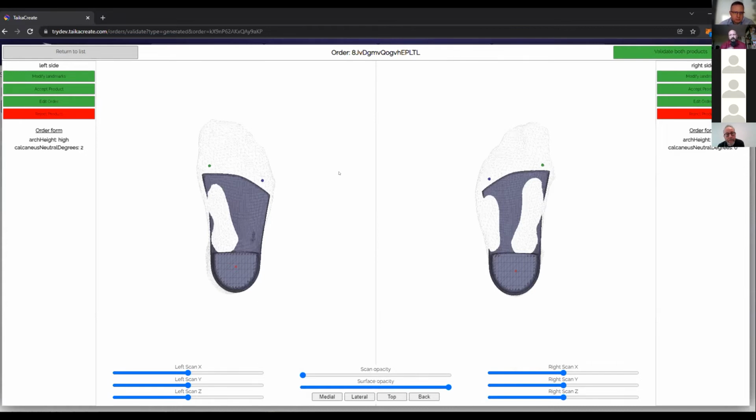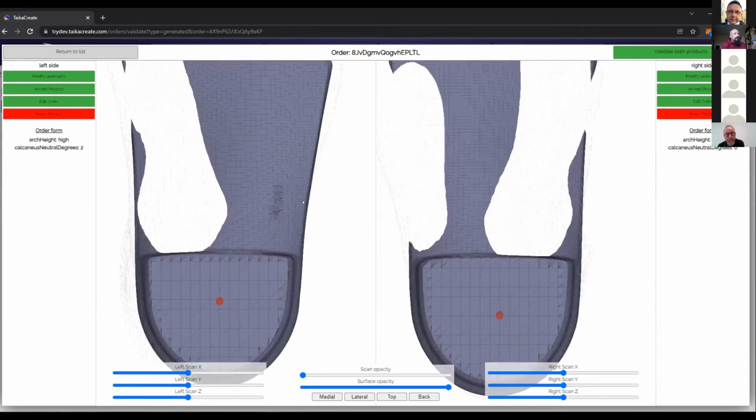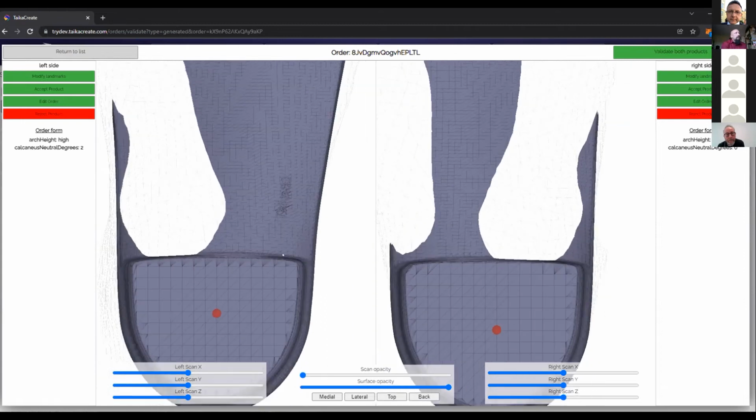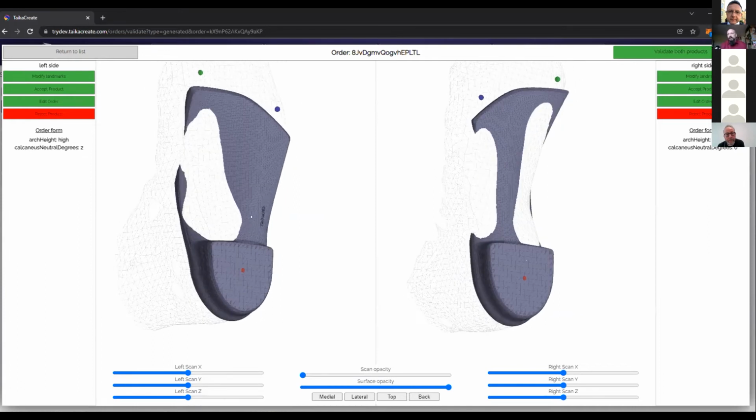So these design elements are usually not there, but text, logos, things like that, serial numbers, that's what we usually do. In this demonstration app, we only have little text there, but these could be added at this stage as well, as long as you can define that, okay, here's my pattern, or here is my texture, and here is where I apply that.